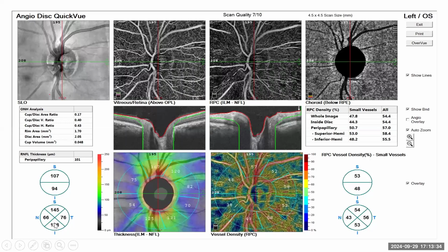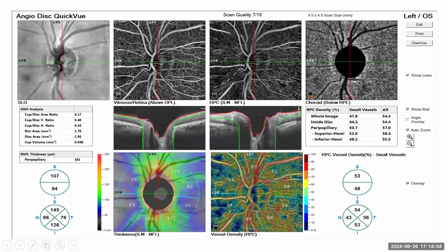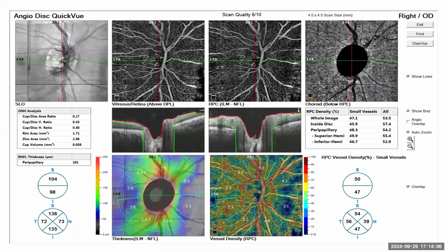And then the fiber thickness looks relatively similar. So this eye will be expected to be healthier than the other eye, except if something else happens, traumatic or other systemic vascular issues, because the vessel supplies are much more compared to the other eye.